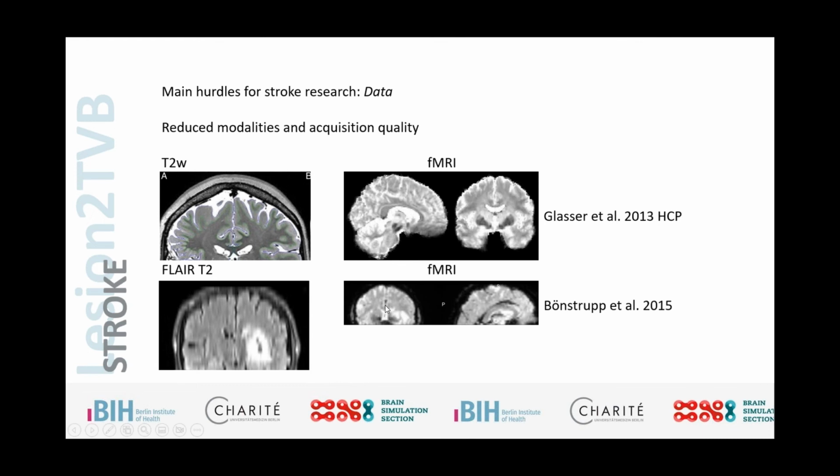Again, this is time that you might have in a research environment, but in the clinical context, you end up with data that might not be relevant to the direct diagnosis or treatment of the patient, as is the case here. So we end up with data like this, where parts of the visual cortex at the end are cut off. We see a lot of the temporal cortex missing. So the data quality is significantly impaired, to the point that there is a lot of missing data.